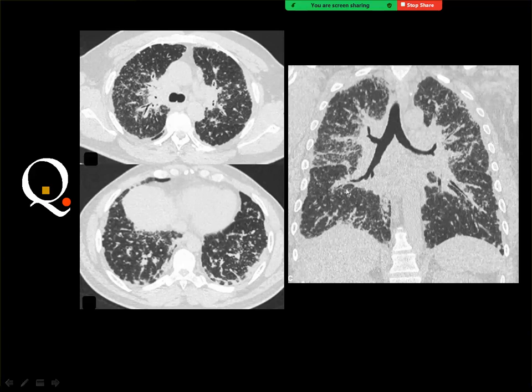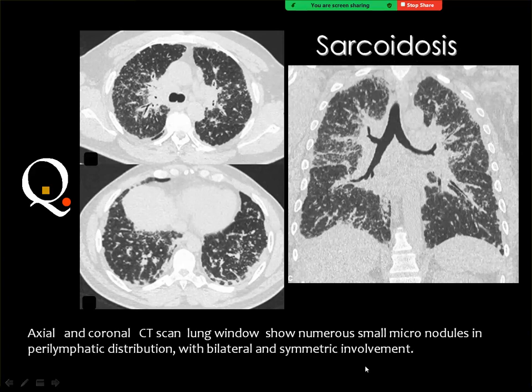But if you see this very, very characteristic distribution, very lymphatic, and you got thickening of the interstitial spaces and nodular lesions arranged along the pleural surfaces, like the fissure, which is the best one to predict these nodules, and also along the pleural margin. This is very important. Then if you look carefully to the hilum and you got big hilar shadow on the left and other hilar shadow on the right, then you are dealing with sarcoid.